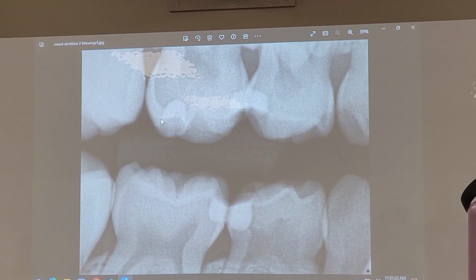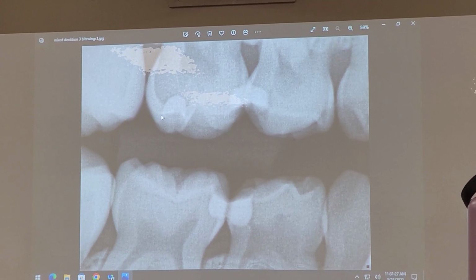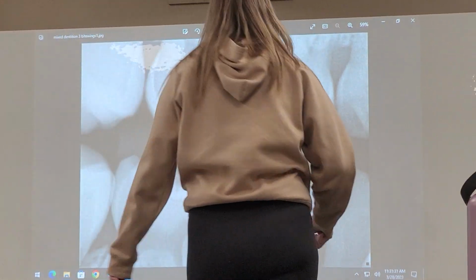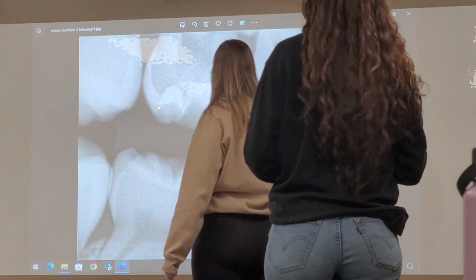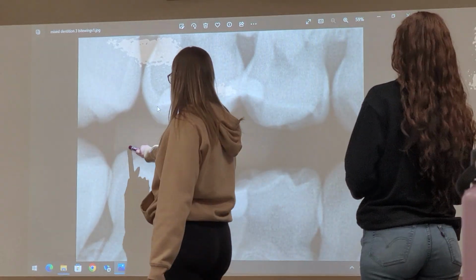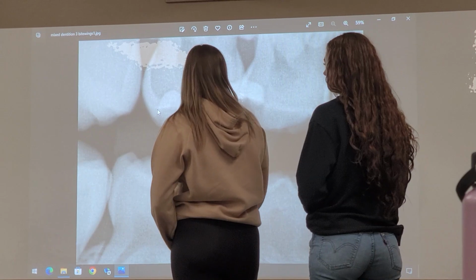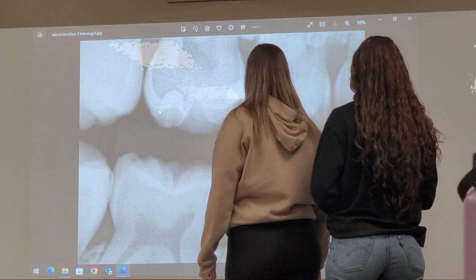You guys need help? Well, can we talk out loud? Yeah. And then have people vote? So this one definitely looks like a primary. Okay. Maybe this one? Just really quick, that one that definitely looks like a primary, what about it makes it look like a primary?